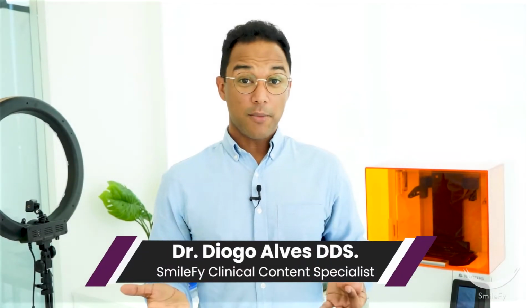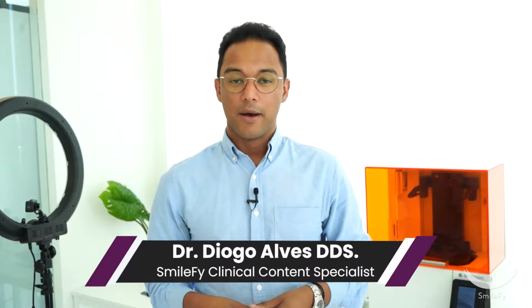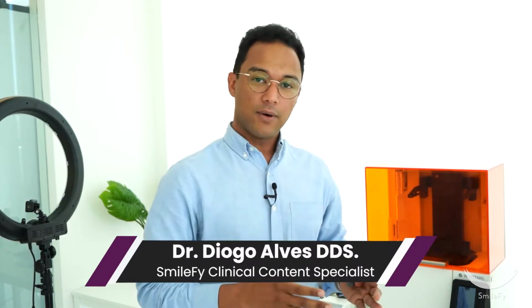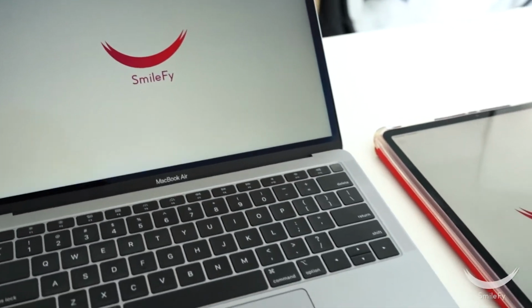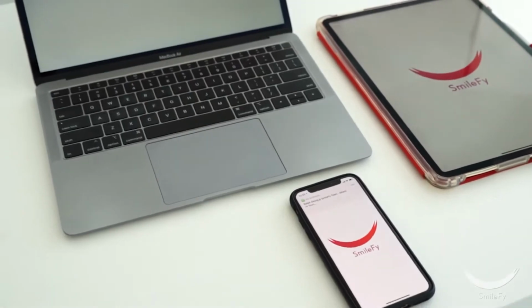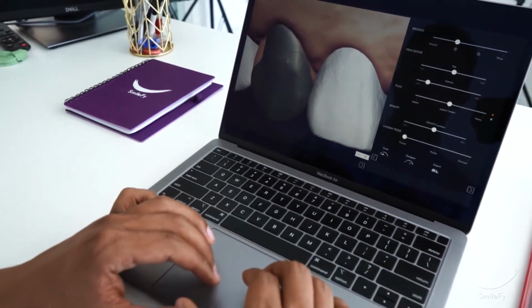Creating and performing dental mock-ups on a patient's mouth is not only important for cosmetic cases, but it's also important for your patient to see the potential final outcome prior to initiating the treatment plan. SmileFy allows you to create an in-office digital mock-up within a couple of minutes, and all you need is a frontal facial picture of a patient and an intraoral scan to start designing.